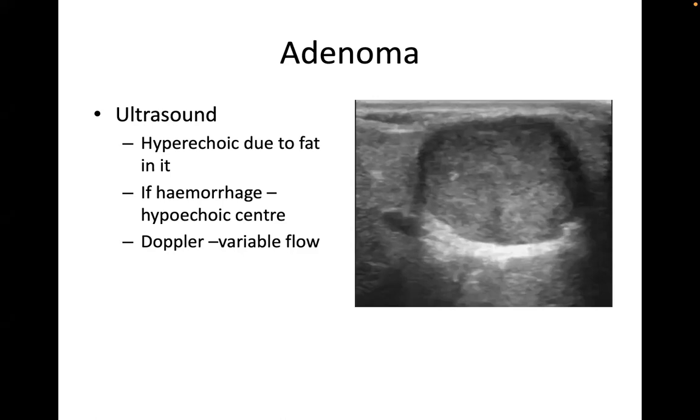And it's very important, as I said, to complement with other modalities, because in cases where you've got hemorrhage, there will be a hypoechoic center that might lead us to confuse it with a focal nodular hyperplasia. But I think you can all see the picture there and appreciate that we can see a mass there that is characteristic of adenoma that is not complicated by central hemorrhage.